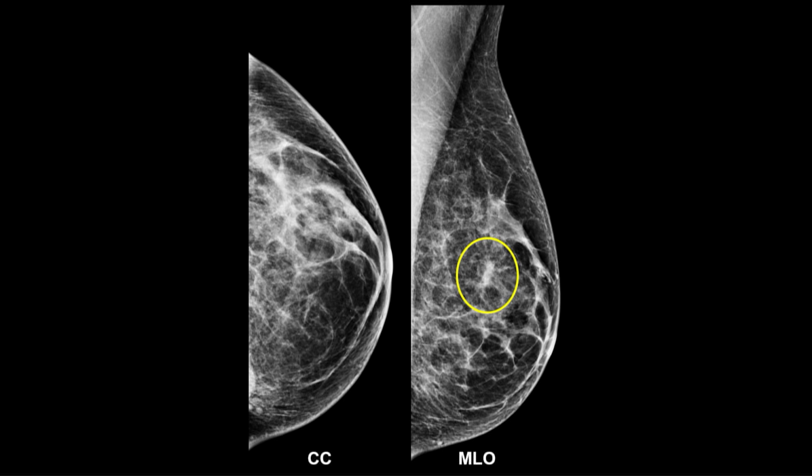So the bottom line is you have to do the mammo workup no matter what the ultrasound shows, which means that you do the mammo workup first. Because if it's a summation artifact, you don't need the ultrasound. When you're doing your workup, you do whichever test is most likely to stop the workup first, because then you don't have to do the next step.